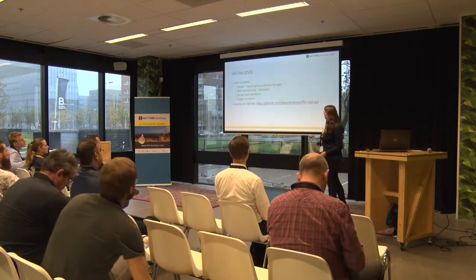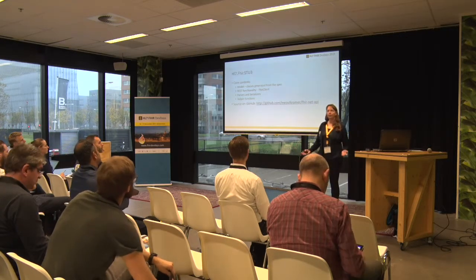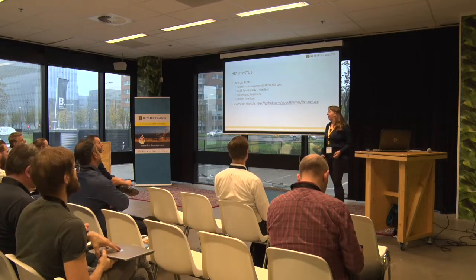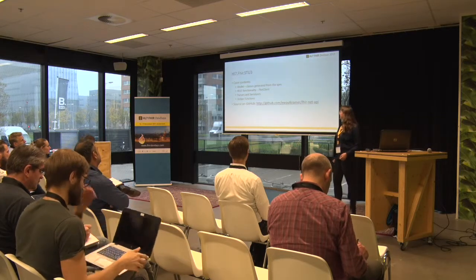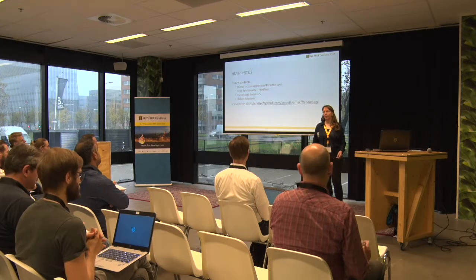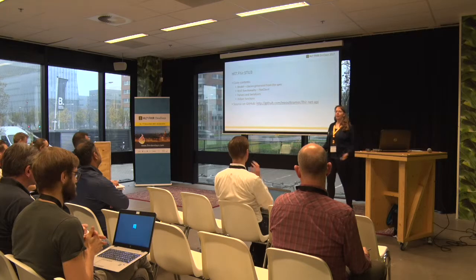So what will you get if you use this package? You get the model of FHIR, so all of the resource and data types are inside. There's REST functionality to set you up with a FHIR client and easily send your requests to a server. There are also parsers and serializers and other helper functions.